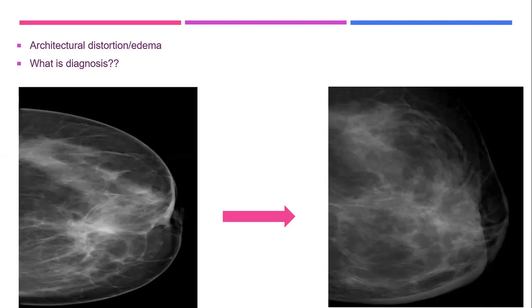So these changes, are they new, progressive, or the same as before? It's not progressive for me on this mammogram. Are you sure? Okay, can you see the skin here? Yes, it's more thickened and more edematous. And look at the fat here. What do you see? Look at the fat in between. There is architectural distortion.